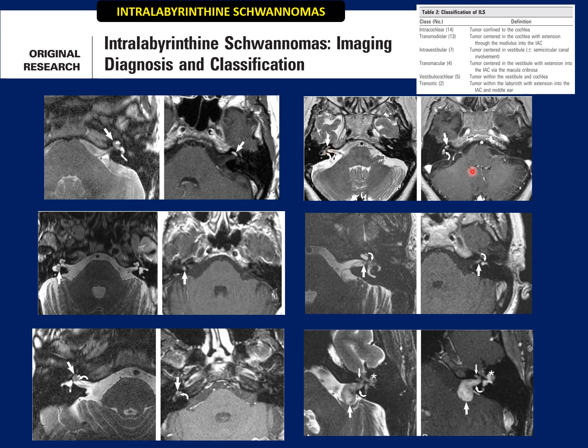One of the interesting things that we saw in this patient was the intralabyrinthine schwannoma. Vestibular schwannoma is something that we commonly see, where there is a widening of the porus acousticus and a soft tissue mass lesion which shows homogeneous enhancement. What are intralabyrinthine schwannomas? These are schwannomas which are purely within the labyrinth, involving either the cochlea or the vestibule, or the intravestibular part of the 7th-8th nerve complex.